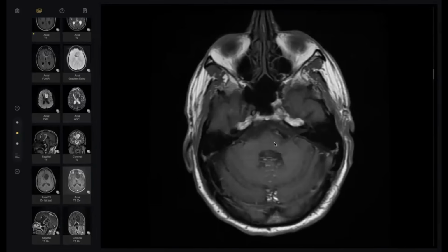Or the opposite: you are dealing with a spine MRI, you find fat globules, and you didn't find any source of it, any fat containing lesion. Ask for higher level MRI, either brain or cervical, like this. Because the whole spinal axis CSF is interconnected.